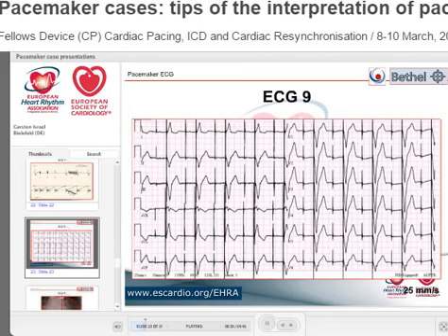Pacing is exactly on the millisecond the same. So if you want to know, is this coincidence or is this paced, you just look if all the spike to P wave distances are the same. They are the same, so it's no coincidence. Atrial pacing is effective. Any atrial oversensing?